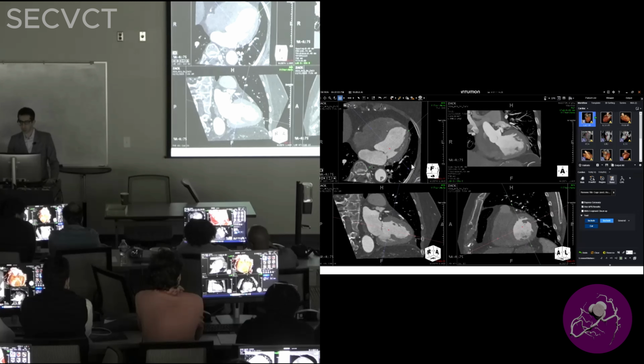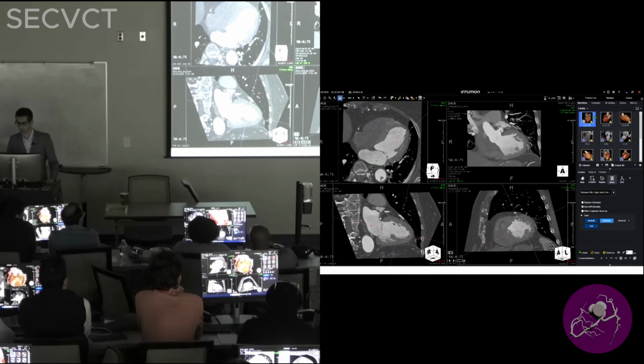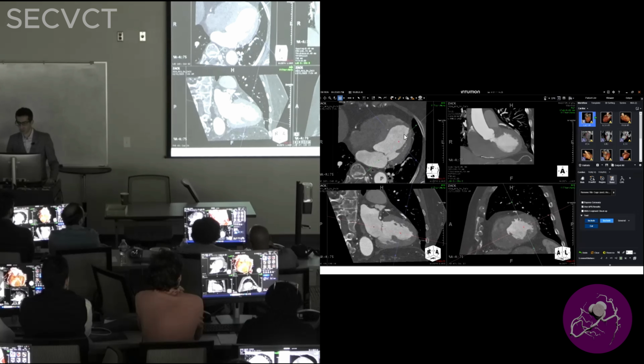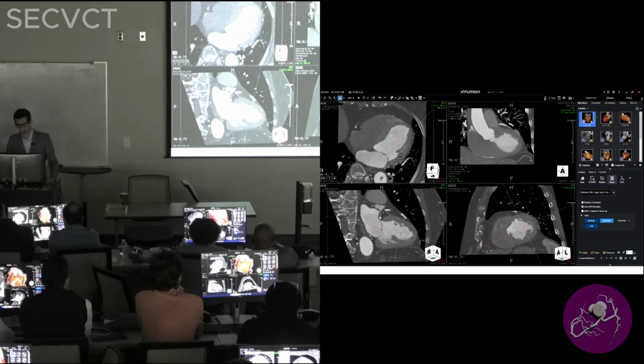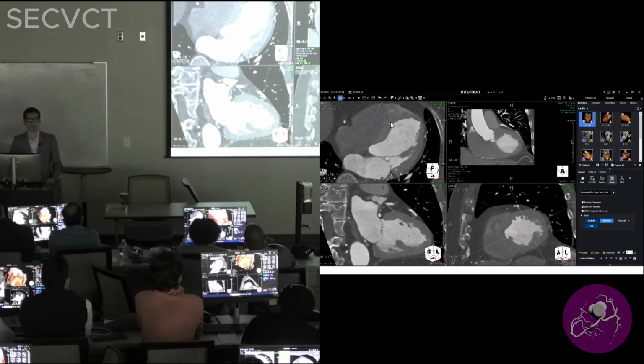So this is a proper 4-chamber. So you go back and forth on the short axis. I'm coming down, and as you pointed out here, it appears to be there's a small cleft here. So, and again here, let me just open it better on the 4-chamber. You see it here, folks. So this is a cleft.